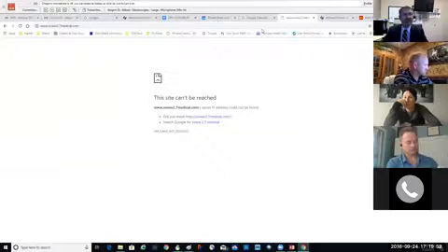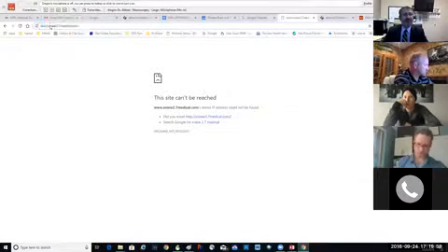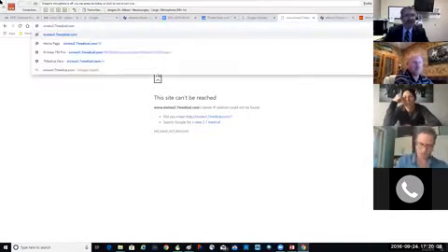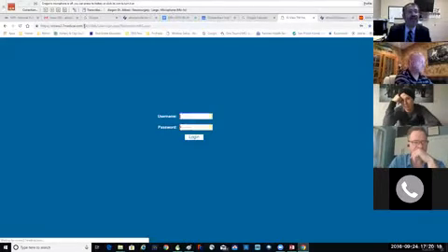Once we sign in, I think you have to have the HTTPS and then format it. I think that's it.